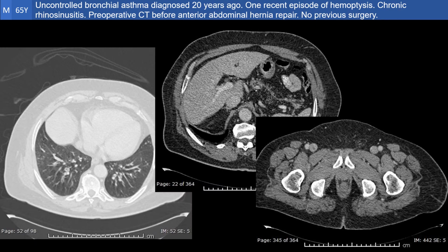So do we need to challenge the diagnosis of bronchial asthma in this case? This diagnosis has survived for 20 years. The answer is yes, based on two features which are quite specific for cystic fibrosis: the fatty replacement of the pancreas and the atrophy of the vasa deferentia.